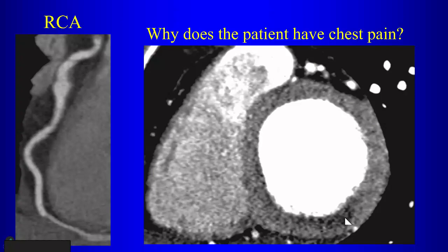If it's an infarct, why would this patient have an infarct there? Well, what's a complication of a coronary artery aneurysm? Emboli. So you can have small thrombi that form in there that can embolize distally and result in small areas of infarction, as in this case.